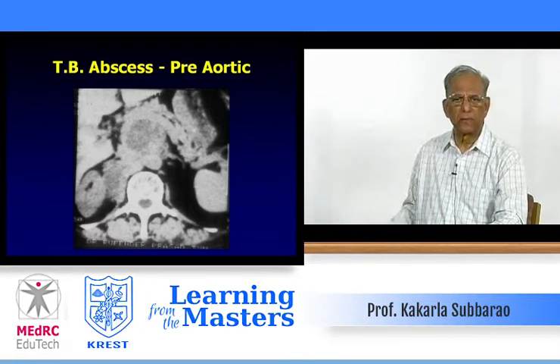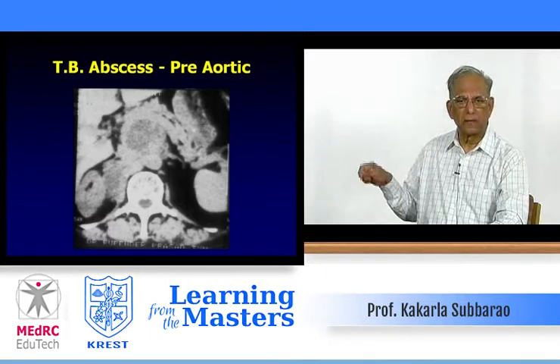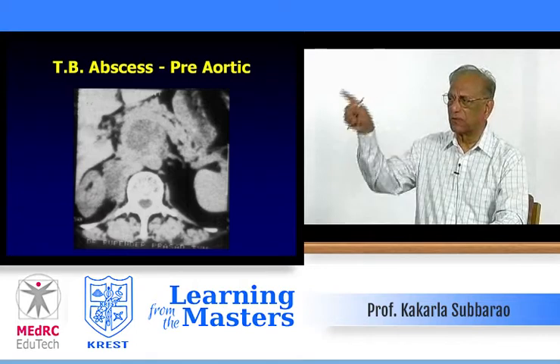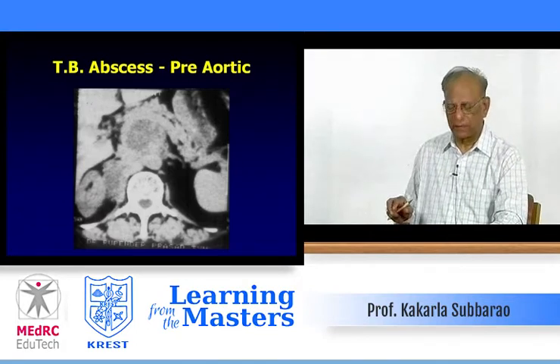All investigations from head to toe were done. Then for some reason or other, ultrasound showed some para-aortic nodal lymphadenopathy, something vague, with a question mark. CT definitely shows that there is an abscess, and it is a tuberculous abscess.